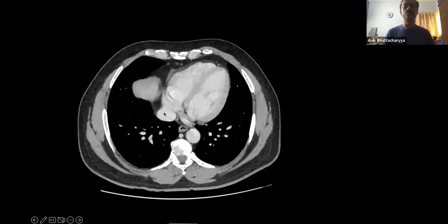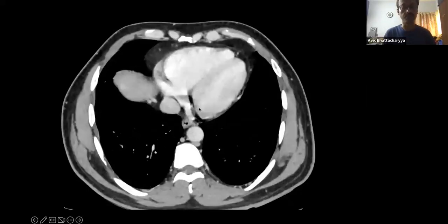Here, I would show you a video. Please try and figure out what structures you are seeing and whether there is any anomaly present or not. This is a CT scan of the upper abdomen, right? And here it goes. It should move because it is a video.